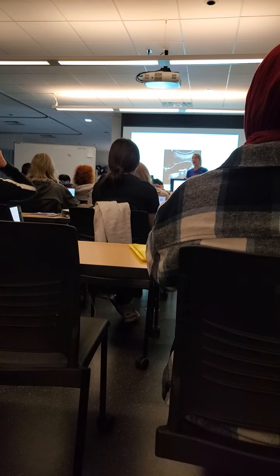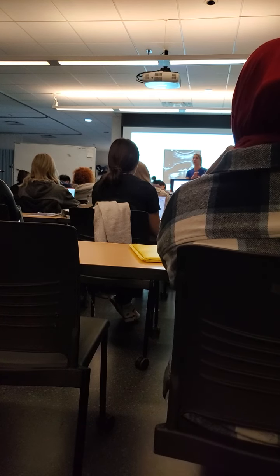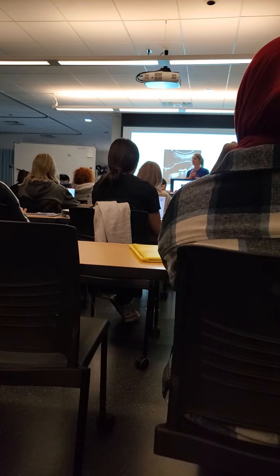You got it. So the difference between this one and the other one with stones is that these walls are normal. The other one had walls that were abnormal due to stones. And this is just the pathology of the stones. So before, we saw the wall abnormality with the stones, we were seeing 2 pathologies, and this is the second one we're looking at. So cholecystitis is just the wall abnormality, and it's oftentimes associated with cholelithiasis. And now we're just picking out cholelithiasis.